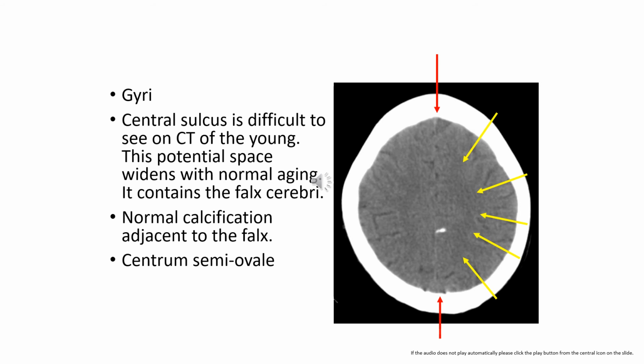This contains the dural reflections of the falx cerebri that we'll discuss later. Note the little nodule of calcification adjacent to the falx. This is normal.